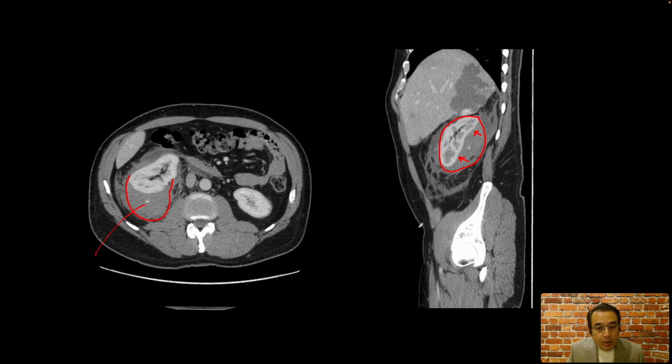And so if the perirenal hematoma or a hematoma which is abutting the kidney pushes the kidney, it's more likely to be a subcapsular hematoma rather than a perinephric hematoma. And whenever there is a hematoma, we want to look for contrast extravasation and make the diagnosis of active bleeding, raise the concern that this patient needs to be treated immediately by either surgery or interventional radiology.